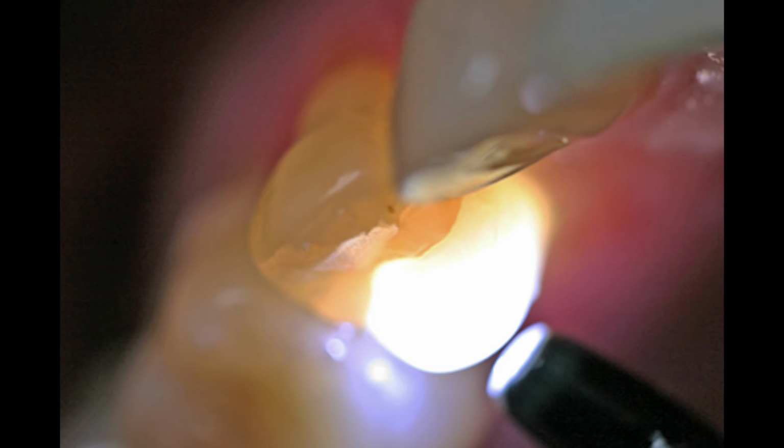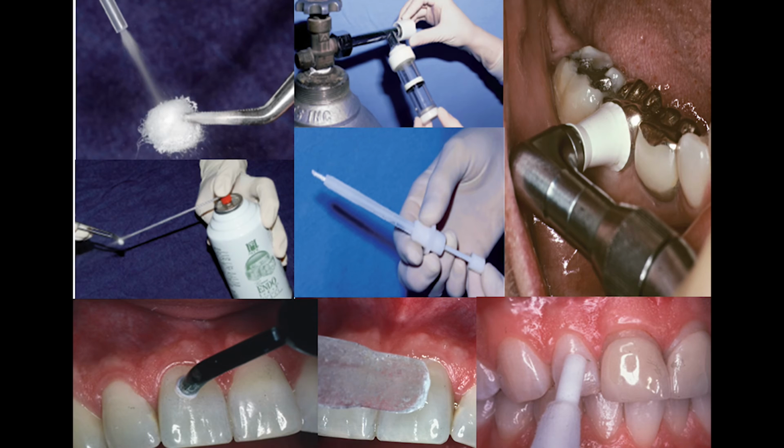In transillumination test, an array of light is shined from different sides of the tooth. The illuminated light is reflected if it meets a crack, resulting in a light and a dark area in the tooth. Currently, a single diagnostic device capable of applying thermal and electrical stimuli and transillumination is not available in the dental field.